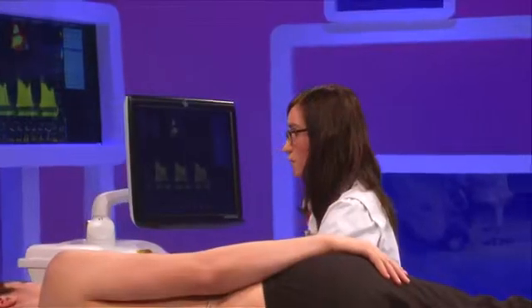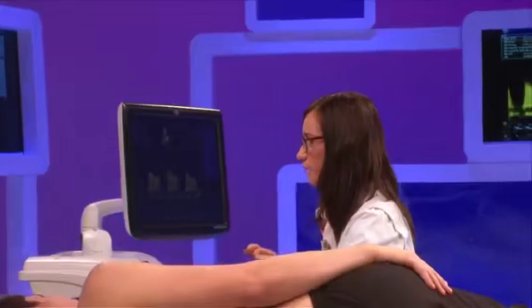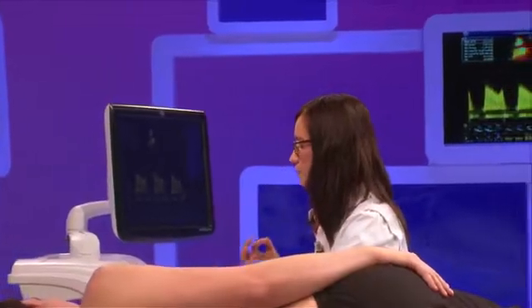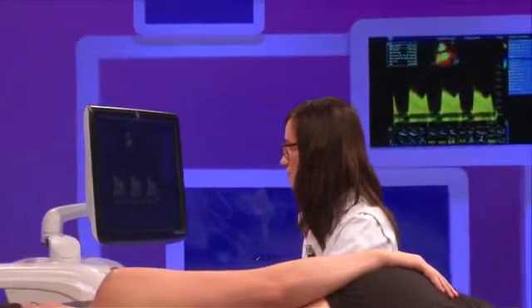However, I have to remind you that, as I said before, the most important is to do 2D planimetry of the mitral valve, which is the recommended measurement. It does not depend on the flow rate, it does not depend on the presence of concomitant mitral regurgitation, and it correlates very well with the mitral valve area that was found in explanted hearts. So it's actually the best, the gold standard in echocardiography to assess mitral valve severity.